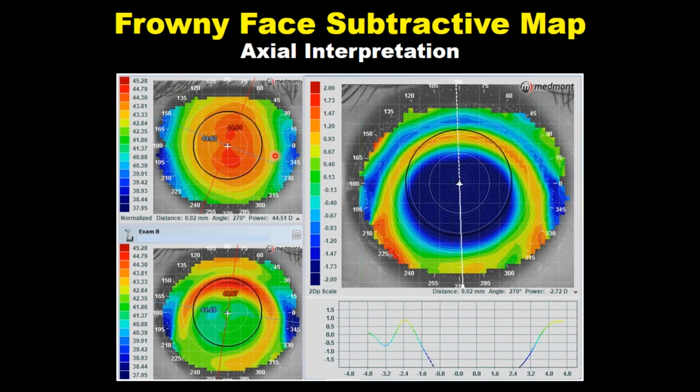We wouldn't expect the cornea to contribute negatively to the centration of our lens in the overnight environment. So I think in this case we might simply have a landing zone angle that's ever so slightly tight, causing the lens to ride a little bit on the low side. Loosening up the landing zone angle will fix this problem up quite easily.